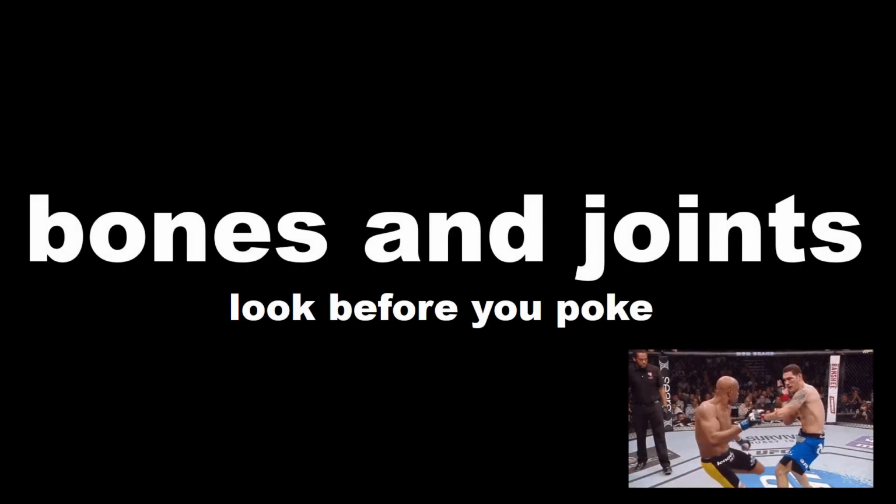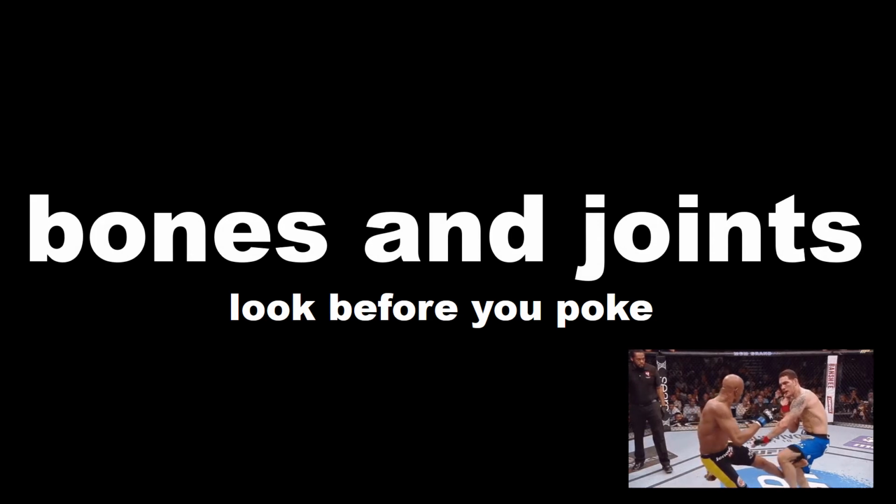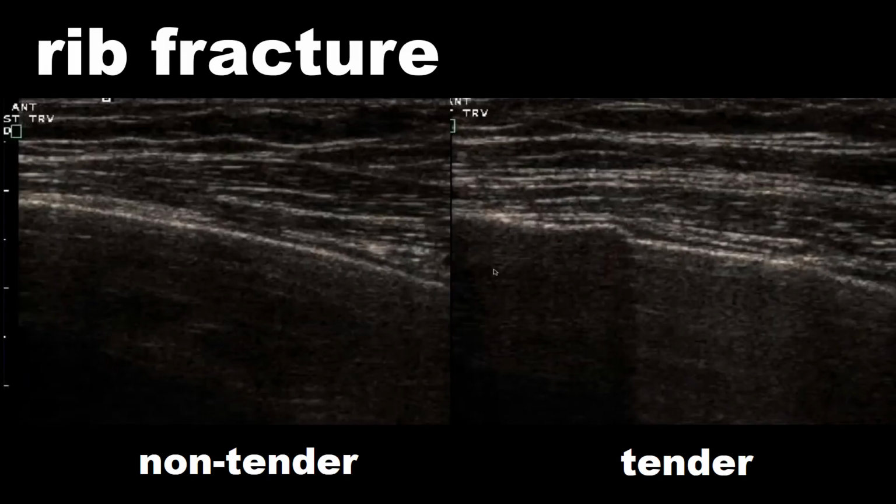We'll move on and we'll talk about bones and joints. So bones on ultrasound are pretty easy to see. They show up as these bright white hyperechoic lines that cast this acoustic shadow behind them, and you're not able to see anything behind the bone.